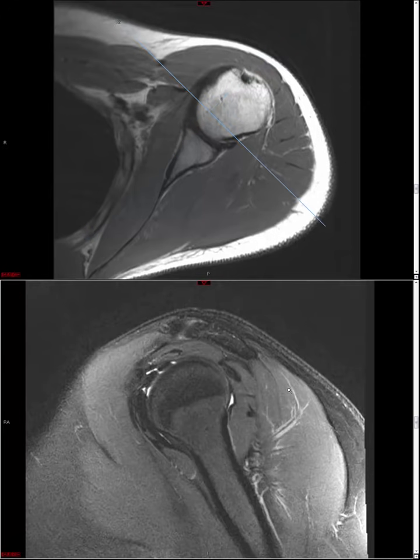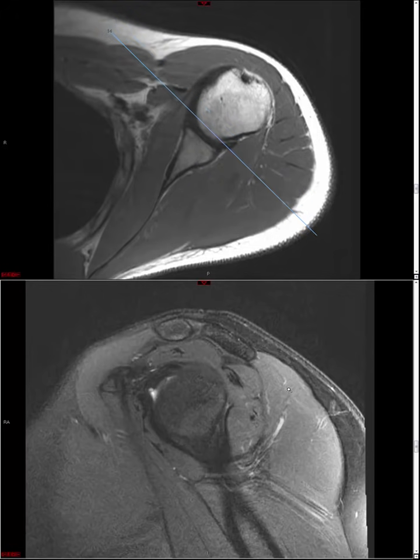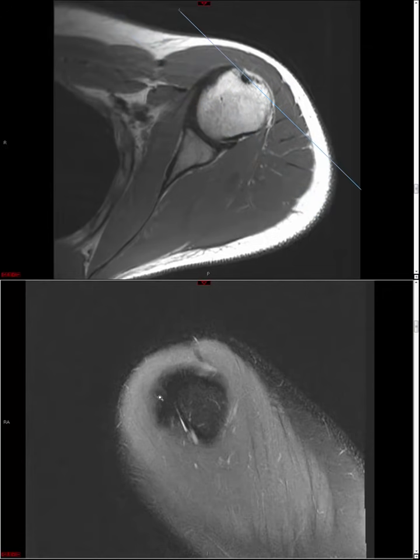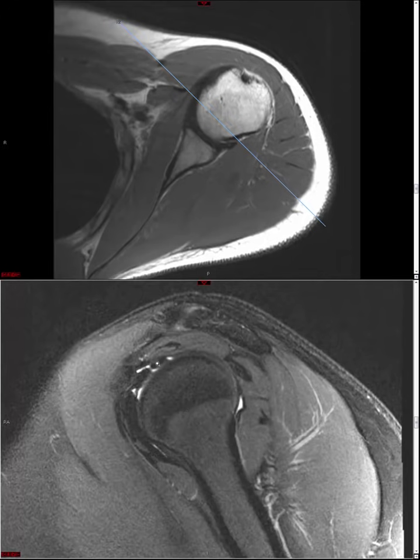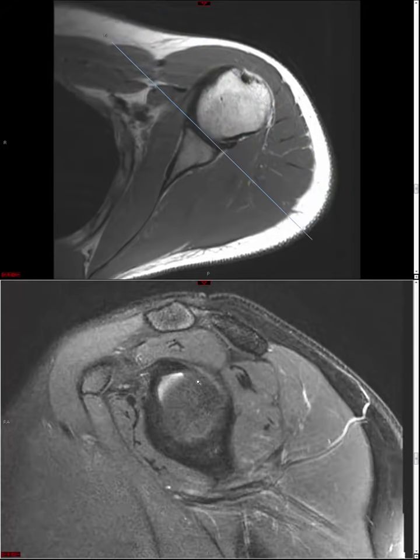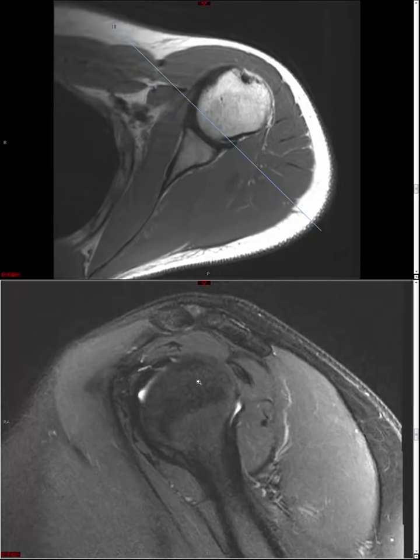We find that the sagittal sequence is especially helpful for assessing the intracapsular portion of the biceps, i.e. the portion that comes off the superior labrum and traverses through the rotator interval prior to entering the bicipital groove. We assess the biceps tendon just like any other tendon. If it's thick and heterogeneous, tendinosis. If we see fluid signal, tears, either partial or full thickness. If we don't see it, then we postulate a complete rupture. You might see an attenuated biceps tendon, and I would generally consider that a good sign for a partial thickness tear as well. So you've heard me mention two or three times now the rotator interval. What is the rotator interval?